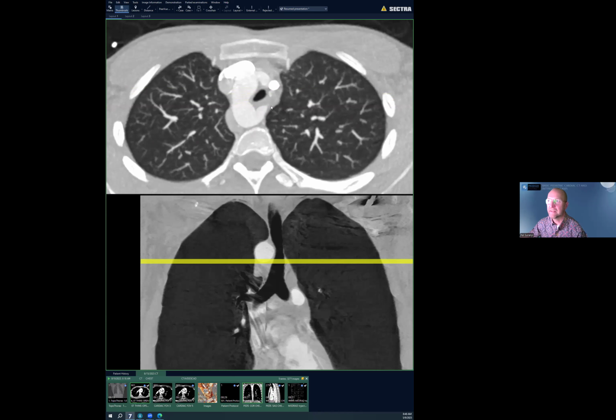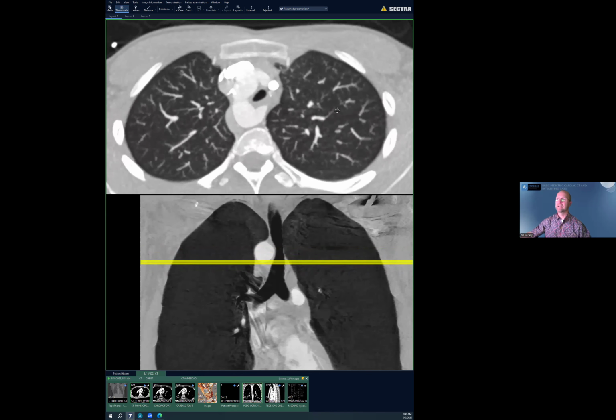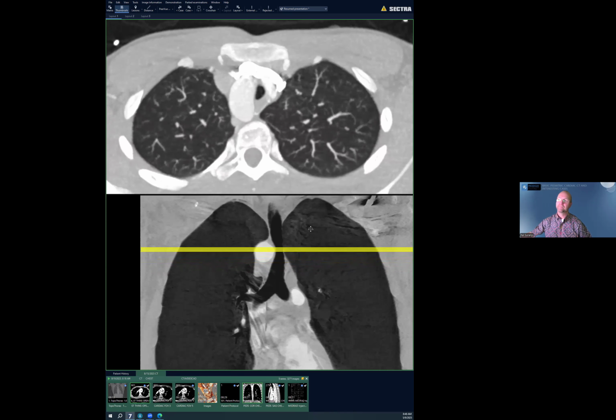The other issue that this can cause is also obviously dysphagia if the esophagus is also compromised. So we have a double aortic arch with a left-sided atretic limb and mild airway compression.